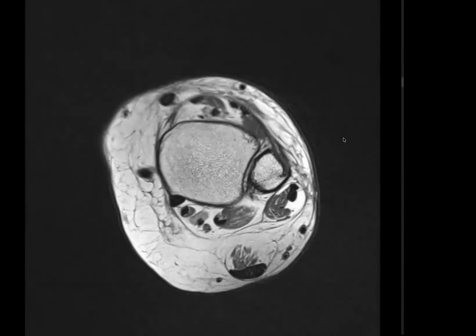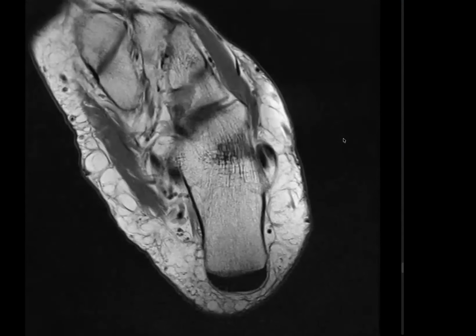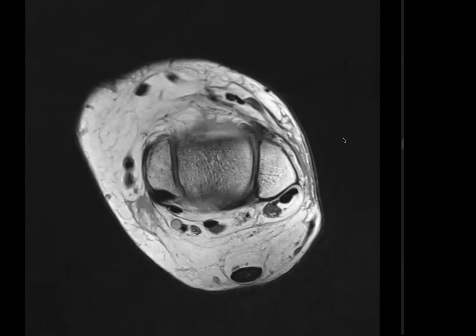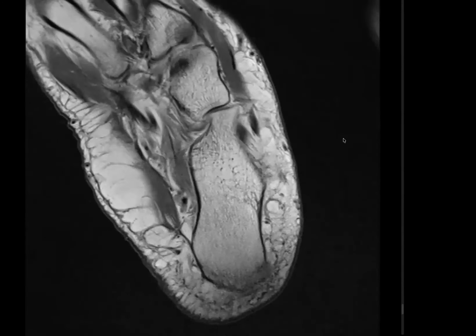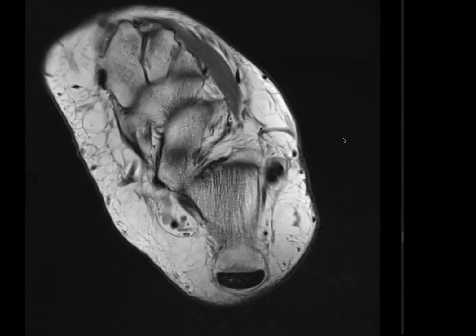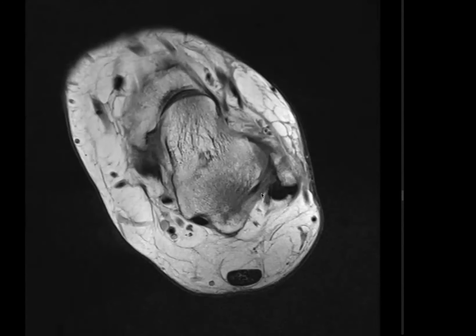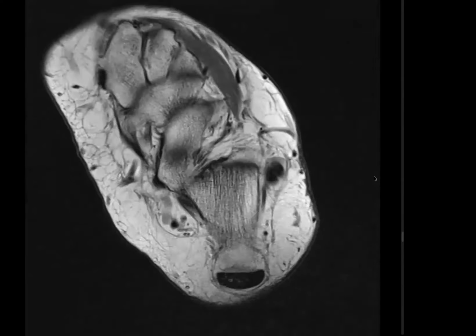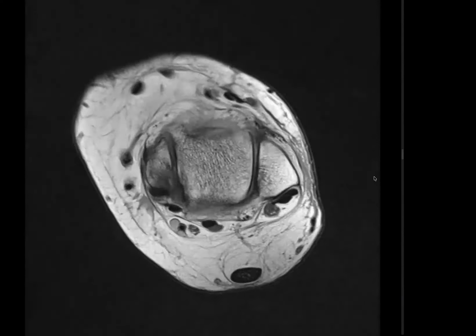I can see that there is normal articulation of the ankle bones on the axial aspect. The tendons show normal visualized lateral as well as medial tendons, with normal signal intensity. I think there is diffuse thickening of the subcutaneous tissue involving the ankle region. The subcutaneous fat appears to be prominent.